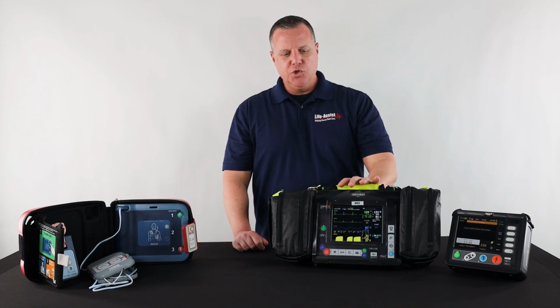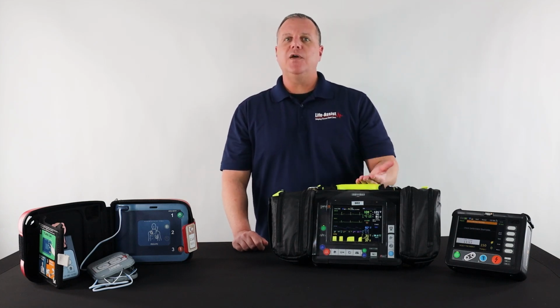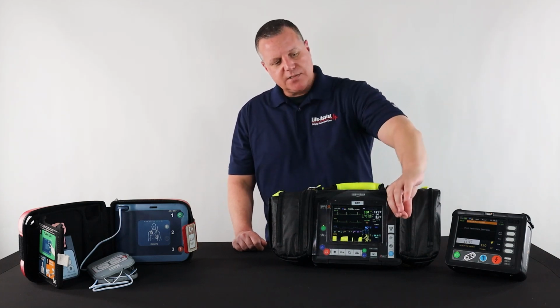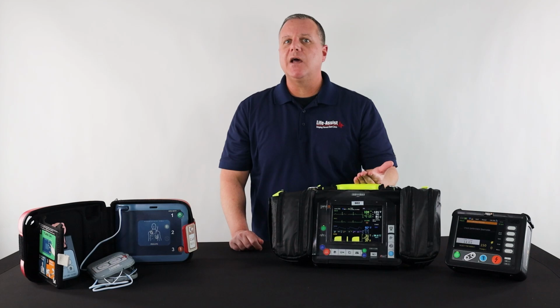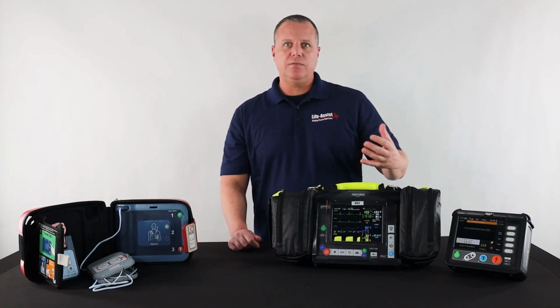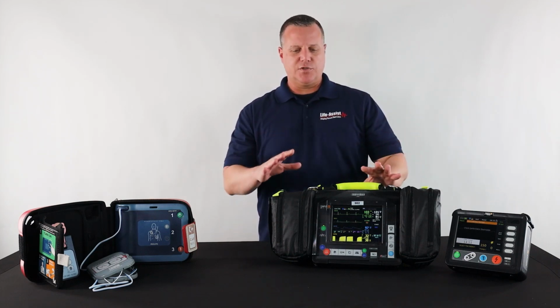A couple of the newer cardiac monitors now are also incorporating video intubation, where they have a video laryngoscope that has a USB plug that plugs in, and then on the screen it'll open up video so you can intubate. There's ultrasound being offered now, where you can do ultrasound. You'll have a screen up there where you can perform that. So a lot of interesting functions here.